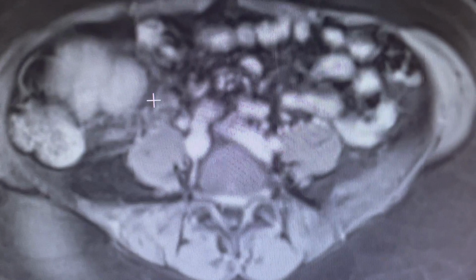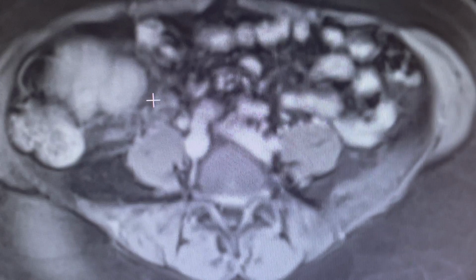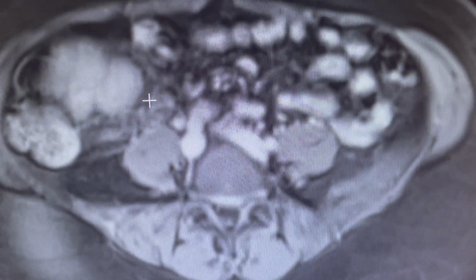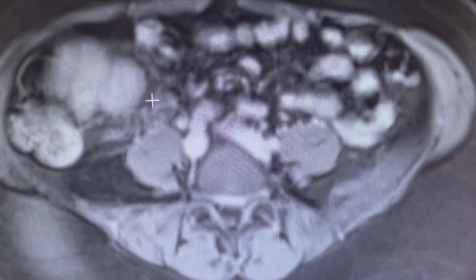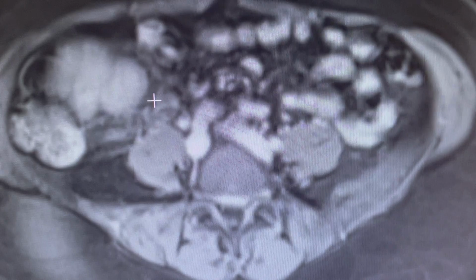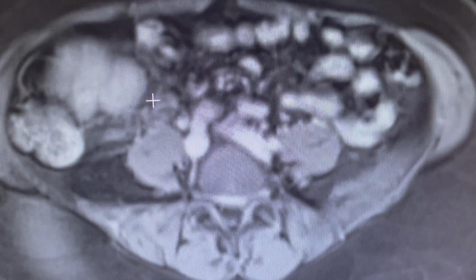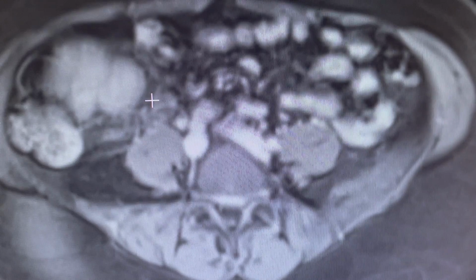They could still be metastases, and they also could be HCCs. So the small lesions could be any of them, but overall, despite this large renal cancer, I'm favoring as a diagnosis hemangiomas for the larger lesions and focal nodular hyperplasia and hyperplastic lesions for the small ones.